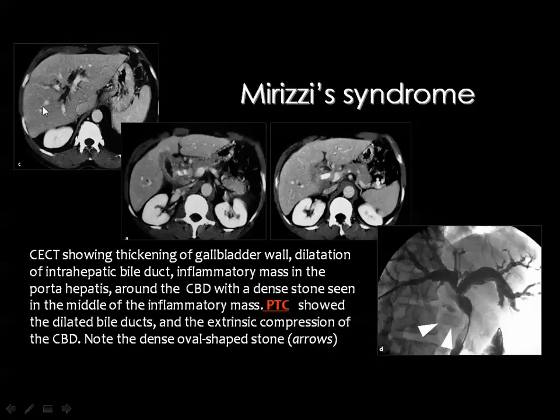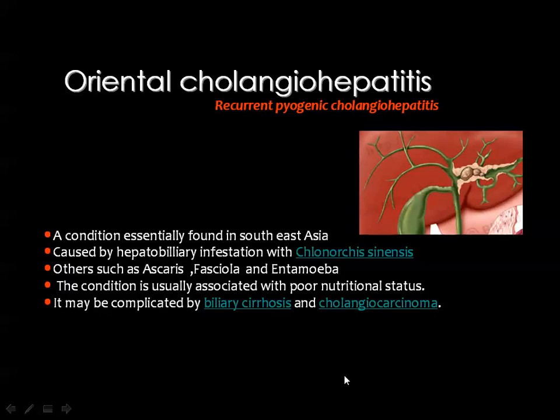Dilated intrahepatic biliary radicals. The gallbladder is chronically inflamed with thickened and enhanced wall. Then you see the stone in the region corresponding to the site of the common hepatic duct, and it is suspected to be surrounded by some inflammatory granulation tissue representing the cause of obstruction.